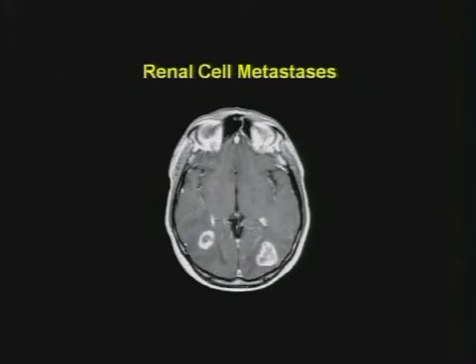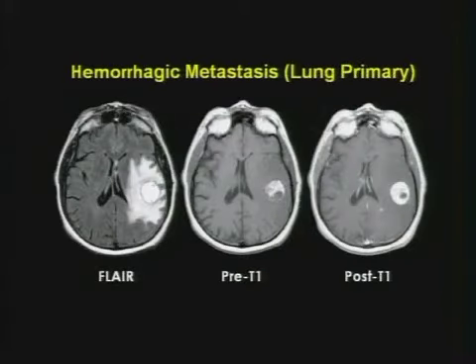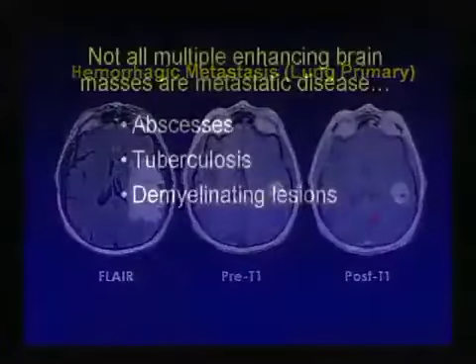Here's a patient with renal cell, 2 masses. Here's a case that I showed you earlier of a gentleman with hemorrhagic lung metastases. And keep looking. We've now discovered several cases where we're so focused on the primary lesion that the second lesion can be easy to miss because you're so overwhelmed by, oh, look at that big Goomba, and then you're not carefully looking at other things.